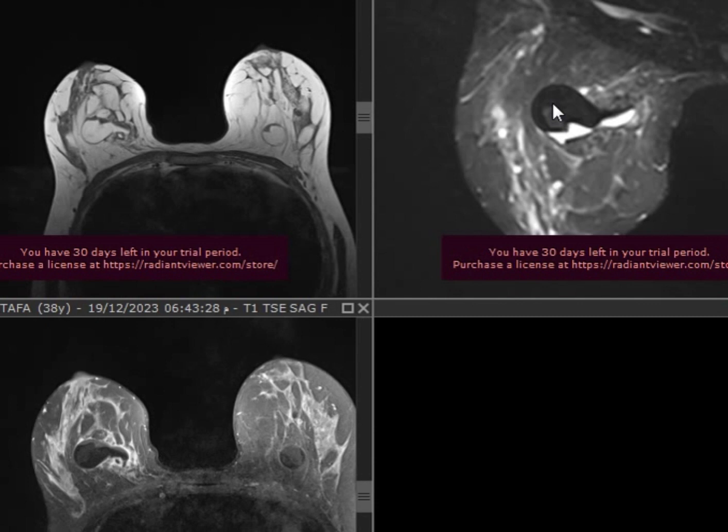She's young, so we didn't prefer to do a mammogram, because first of all the young age, and second, she probably will have very dense breasts and it will show nothing significant. Cystic with fat fluid level, exactly. I did an ultrasound for her, and surprisingly, on ultrasound you see exactly the opposite: the fat is up and the fluid is down. I couldn't see it by ultrasound, but we didn't do a mammogram.